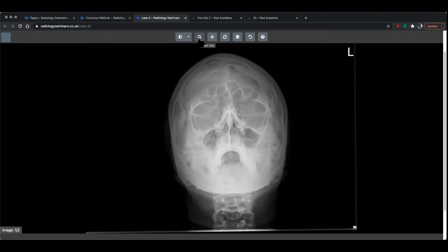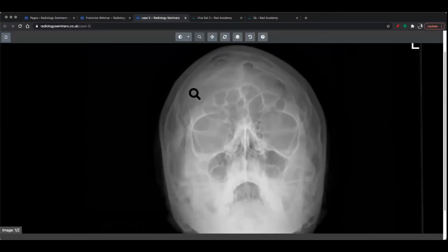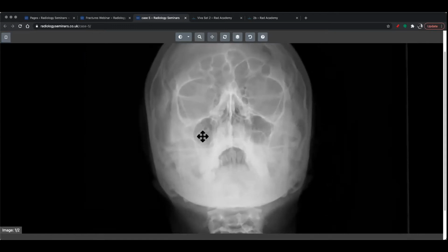Now, generally speaking, when I come to these sort of x-rays, I try and look at the things that the x-ray wasn't meant to be for. So I would try and make sure that I've had a good look at that C-spine. Even though this is a facial x-ray, I would look at the C-spine. But yeah, exactly right. Someone's thrown their opinion in, and you're completely correct. But I'm just going to work through it. So when you're looking at the facial bones, the common thing that we try and think about is that there's this thing like a tripod or like a chair or stool, as well. So as if a little elf is going to sit right over here. And you just want to make sure that everything is continuous.